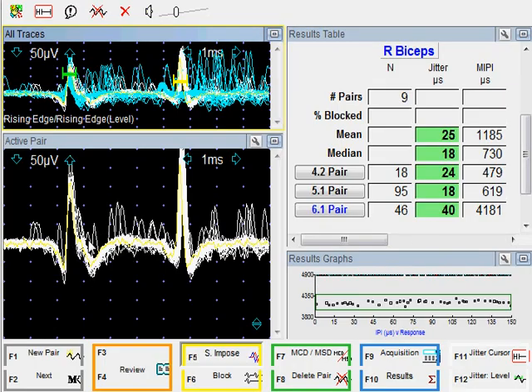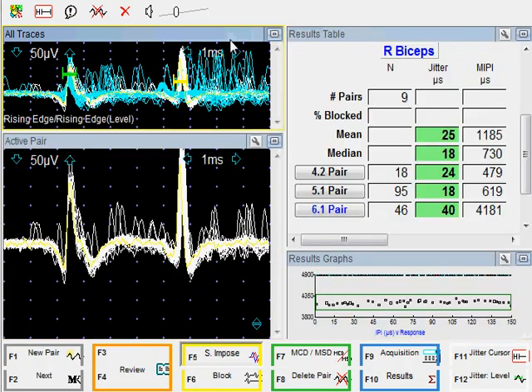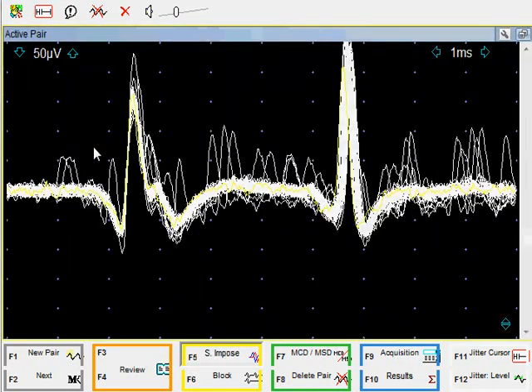Well, we have cleaned up the signals quite well. We had so much background interference and other things. The jitter was normal, and therefore the traces that are in blue color that probably crossed only one window but not the second are thrown out automatically. We have some interference over here. Perhaps this is a high amplitude potential, so I'm going to draw the magic rectangle and get rid of it. And I think that's the only editing I'm going to do for this trace.